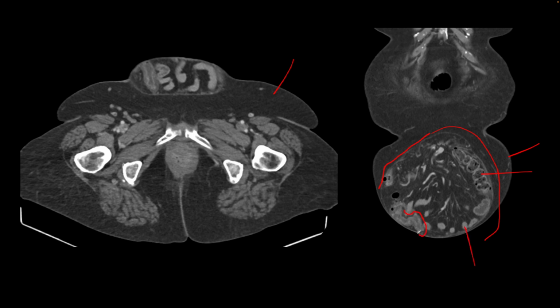It contains an inflamed appendix, which is also seen here, a tubular structure with thick wall, enhancement, and distension. So very interesting case of acute appendicitis happening inside the hernia. They underwent surgery.